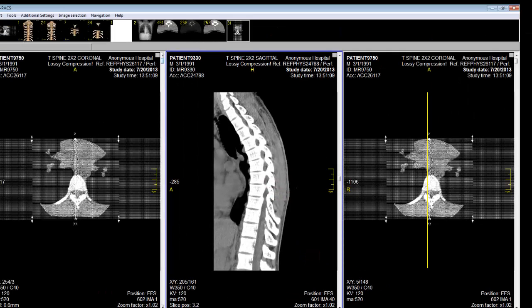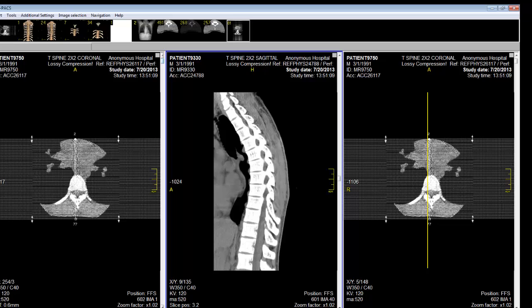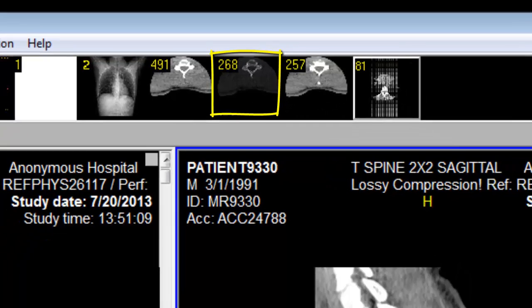Typically, when you are learning to read two-dimensional CTs, it is best to display 3 tile screens in order to see axial, coronal, and sagittal sections. Once the computer has set up the screen into 3 different tiles, then you have to load in the axial, coronal, and sagittal sections. So I'll start right here with the number 9 image stack.